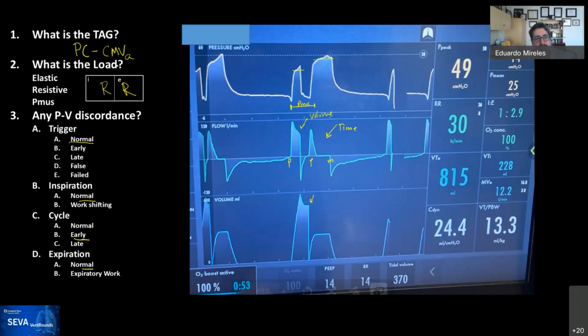So before I go to the load, the question is, how do you know this is adaptive? Just looking at this waveform, it's a little bit hard for me to say. But this is the way that this mode behaves when it does this. This is the part I don't know: why the second breath is higher than the first breath in terms of pressure. It doesn't make sense to me, but it's part of the algorithm that the Servo-U engineers put in, and that's how that pathway looks.